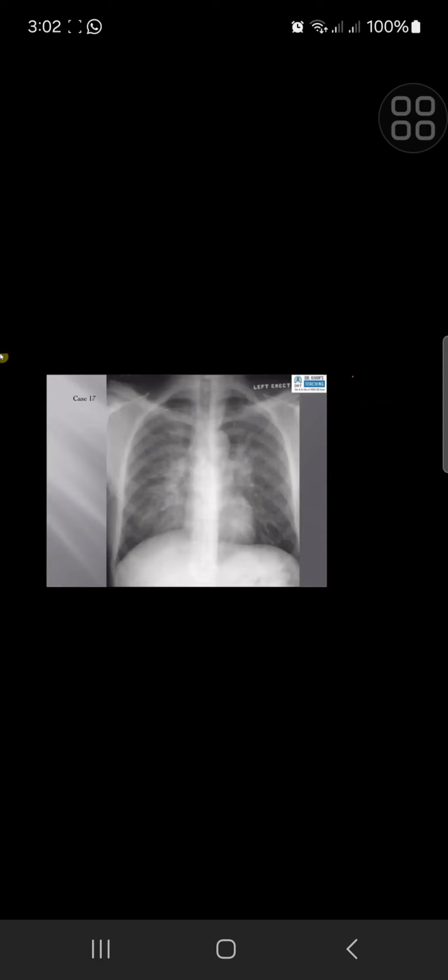I am presented with a frontal radiograph of the chest. There are increased reticular and nodular opacities, micronodular opacities, most pronounced in the upper and mid zones, with sparing of the costophrenic recesses in the lung bases. There is also increased bilateral hilar opacification.